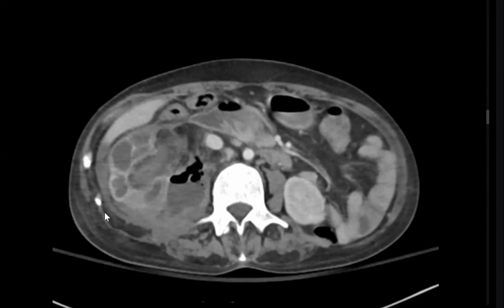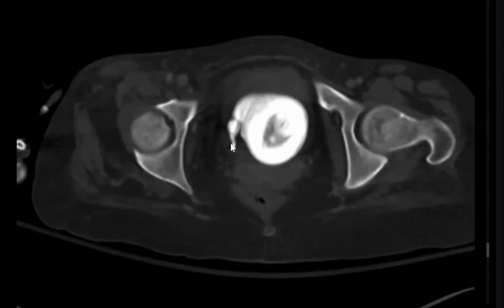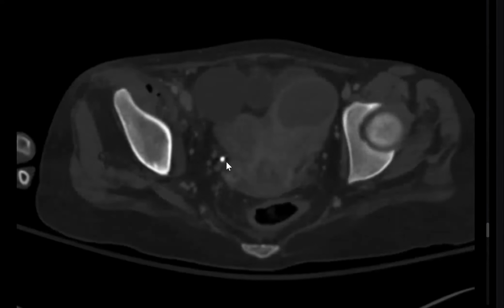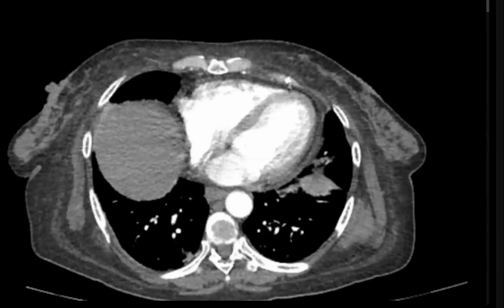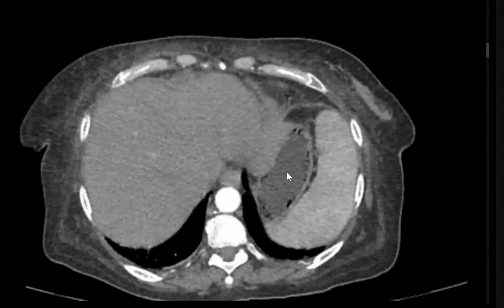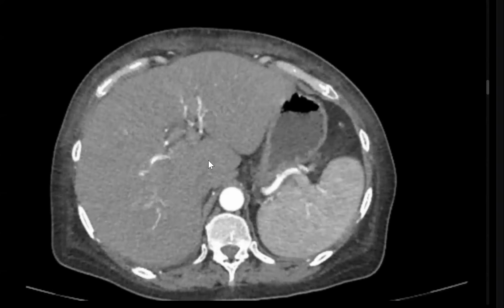I'll give you another case. This is a calcified ureteric catheter. It mimics a stone in the urinary bladder and also here along its course. Okay, here I'm provided with CT images, contrast enhanced. What is the history of the patient? No given history. Renal impairment. Okay, I'm scrolling through the images before giving my comment.